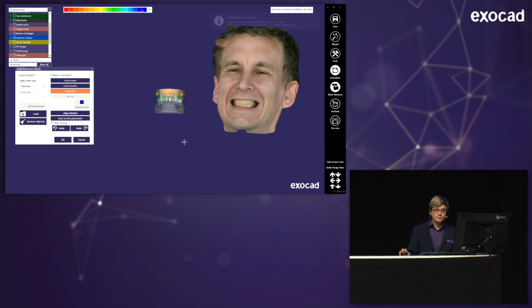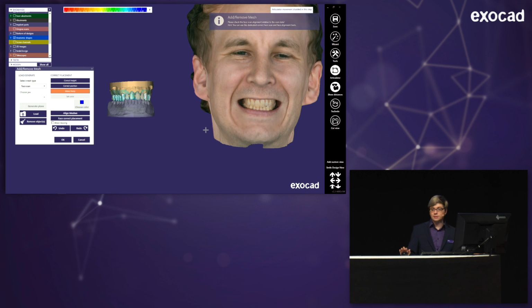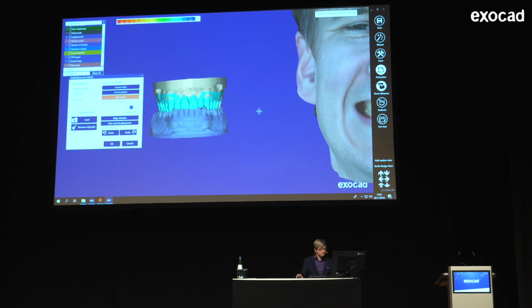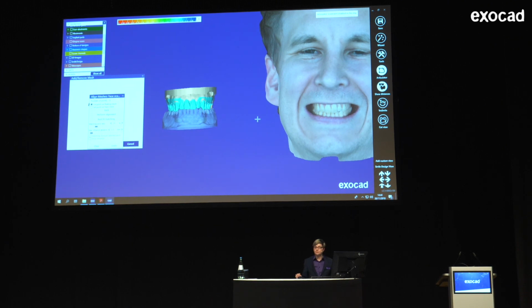so, and here it is. And now you have to actually kind of align those two meshes, which isn't super easy to do, but it works. And for that, I'm hiding everything except my pre-op model. This is what I want to use for that. So because I can normally align the meshes, and here you have to place, as you may have seen several times, just some points on both meshes so they get aligned.